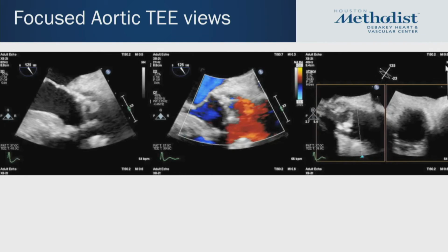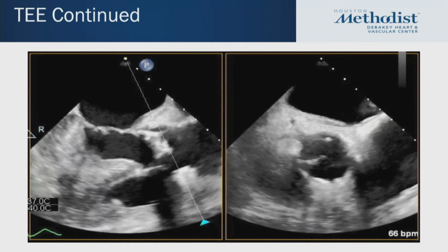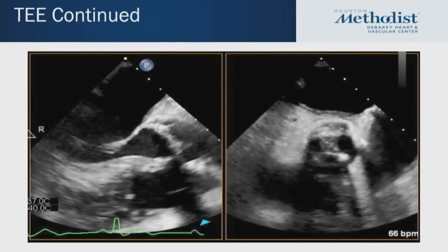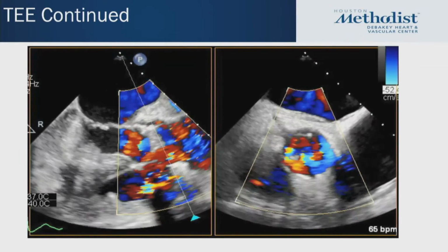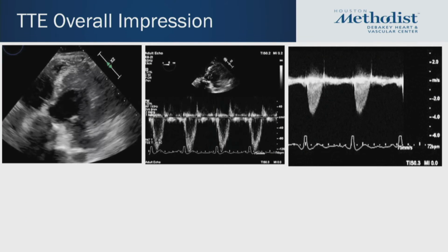We don't have the baseline echocardio TEE at the time of surgery to compare. However, this area is concerning, especially here at the takeoff of the right coronary artery. This area is significantly thickened and concerning for an area of abscess formation. By color Doppler, we don't see any communication there to suggest pseudoaneurysms or fistulization, and there's no regurgitation.